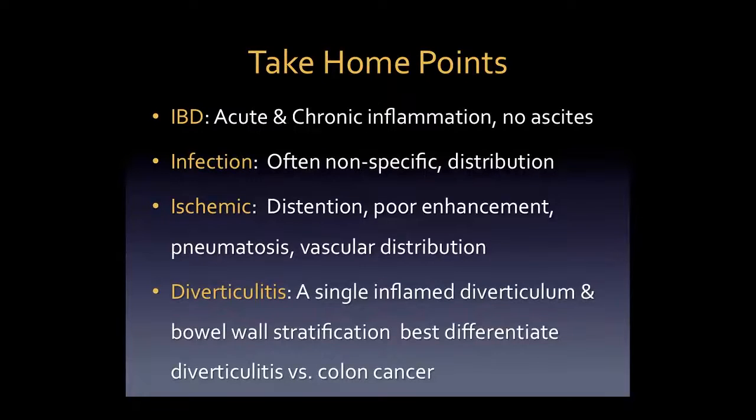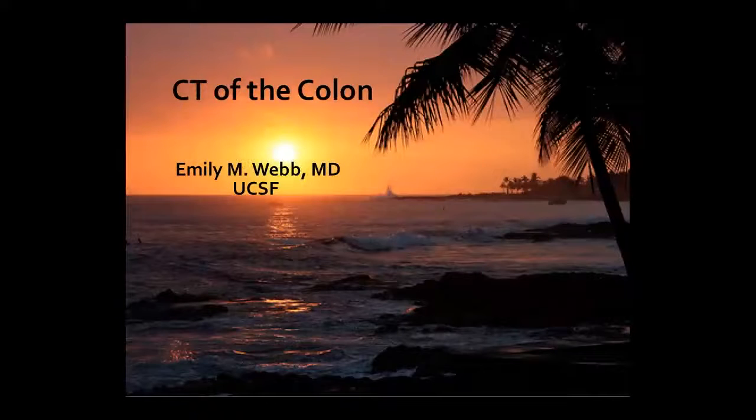And for diverticulitis, the best two signs to differentiate from colon cancer are a single inflamed diverticulum and uninterrupted bowel wall edematous stratification. Thank you very much.